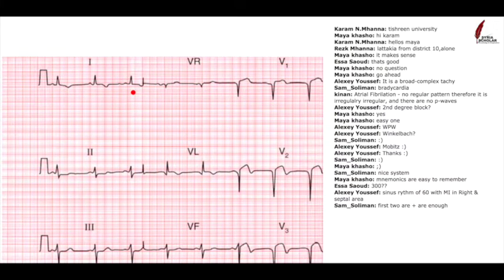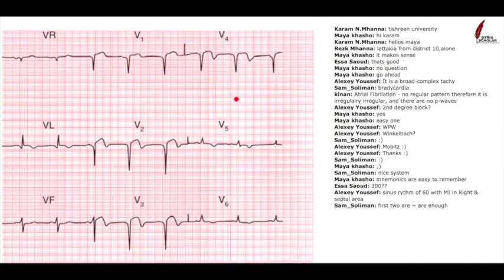So let's look over to the other side of the heart. Let's look around here. Okay. We looked at the left part before. Again, these are all pretty stable, the ST segments. What about here? So let's take our isoelectric line. And you see, you have this. There's definitely ST segment elevation coming above the lines on all of these sections. Can everyone see that very clearly?